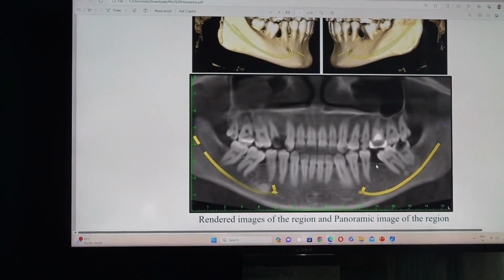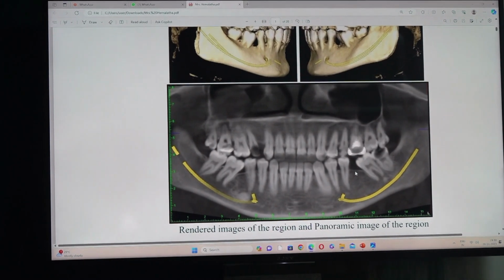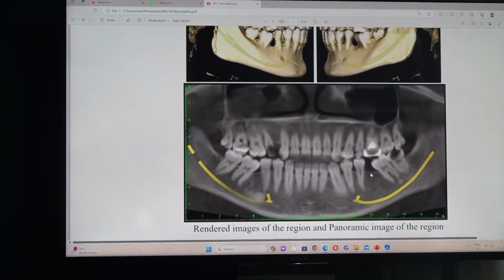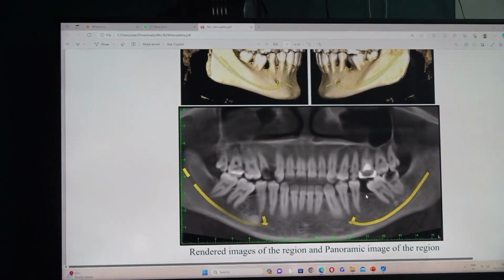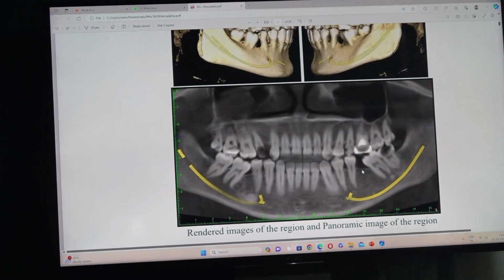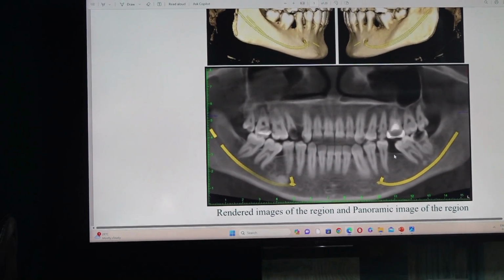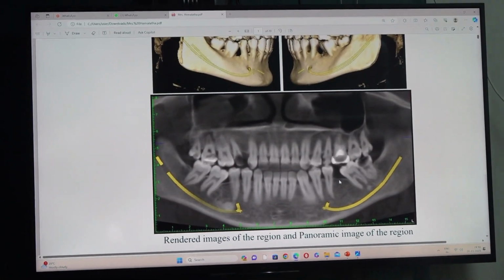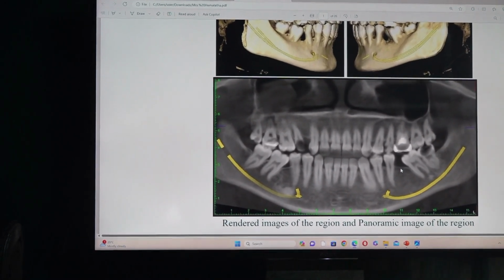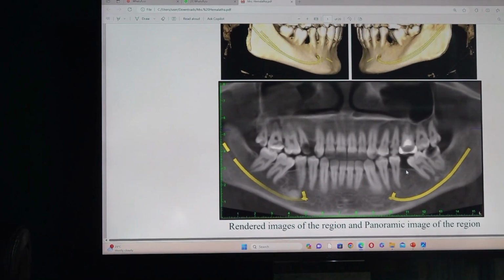So this is the tentative plan. Do enameloplasty, mesial enameloplasty for 3-7. Check the carrier whether it is fitting. Select a 4 or above diameter implant. The length is 10, 11.5. More than 10 you can definitely place. The canal is far away. Why are you selecting 10? More than 10. It may be 11.5 or it may be 12 or it may be 13.